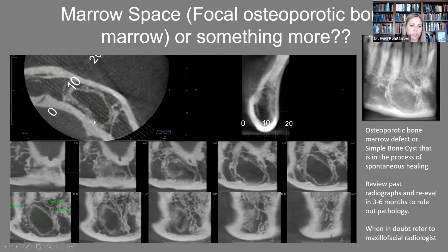We're looking at an anterior mandible. I know this is turned a little bit cockeyed here, but this is our anterior mandible. And this particular patient was completely asymptomatic, nothing going on. This was a completely incidental finding. And it looks like we have something. Definitely a hypodensity. Look at the border to it. The border to it is kind of atypical. It's kind of a thickened and sclerotic border. So definitely a very different border.